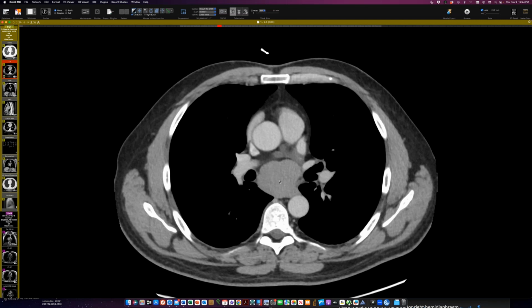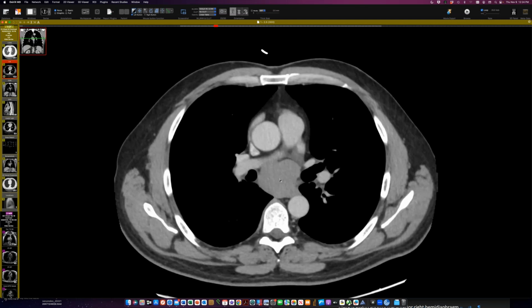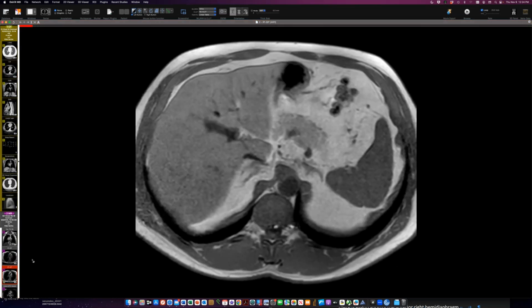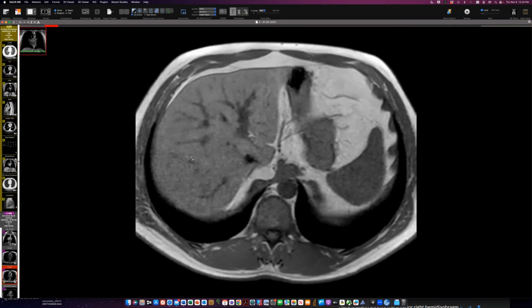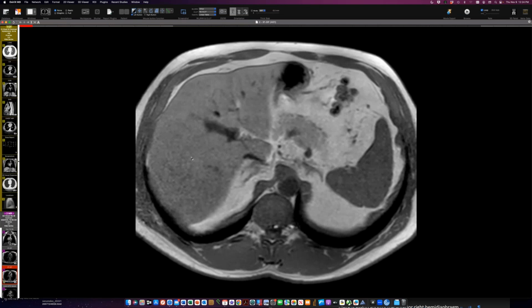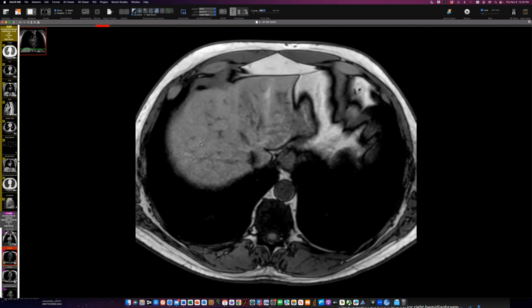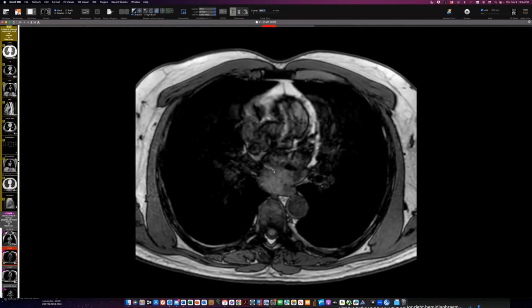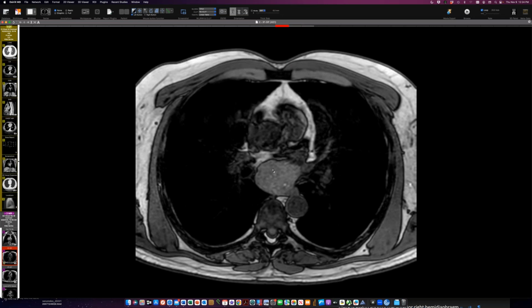It's very uniform though. And on MR imaging, let's see, I think this is the one that shows it's consistent with proteinaceous fluid here. Let me get the right sequence for you guys. I think this may not be it. So sort of not as white as CSF here, so consistent with proteinaceous fluid here, very uniform. And so this is a classic finding for bronchogenic cysts.